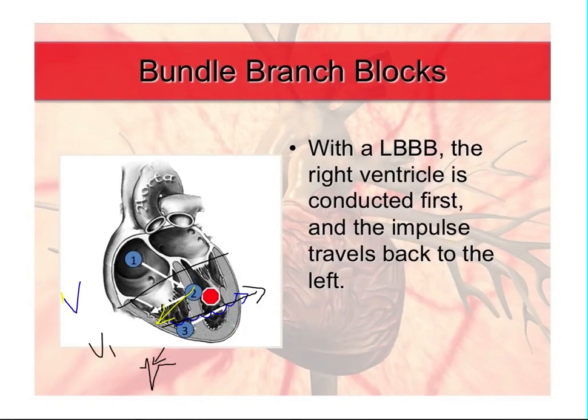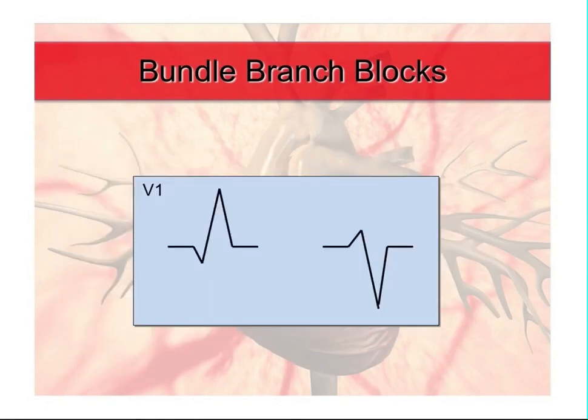Interesting, the last wave of depolarization. So looking at these two different possibilities here, if we're looking at V1, the first thing you're going to do is identify whether it's supraventricular or not. So either we have P waves with every QRS complex, or it's irregular, or we have some sort of understanding that it is a supraventricular rhythm. Okay, it's not ventricular. That's important.